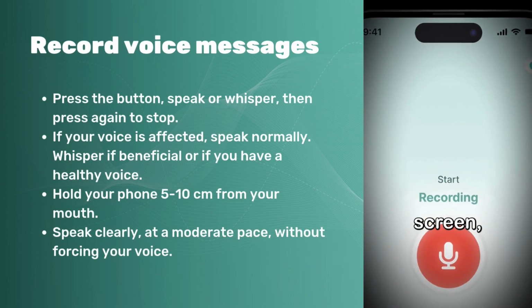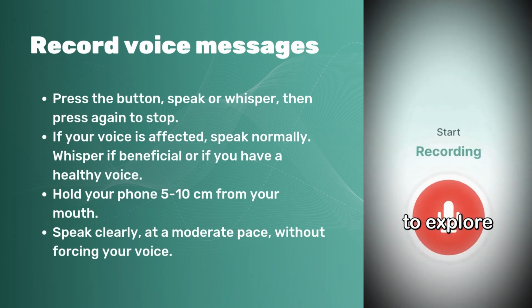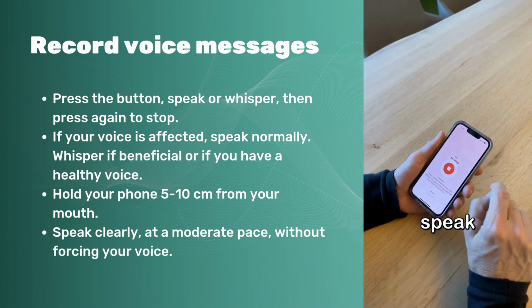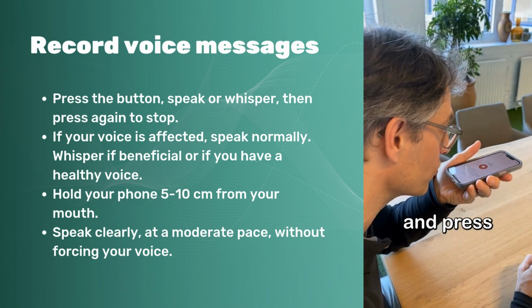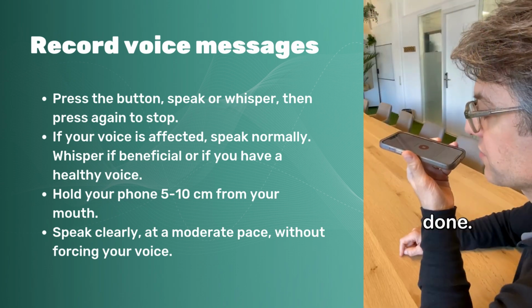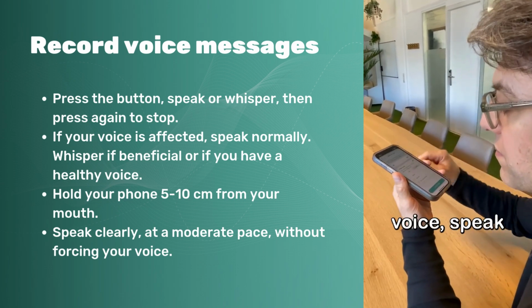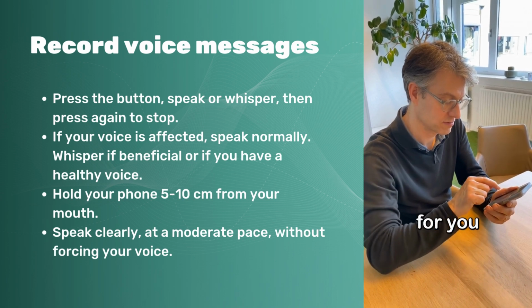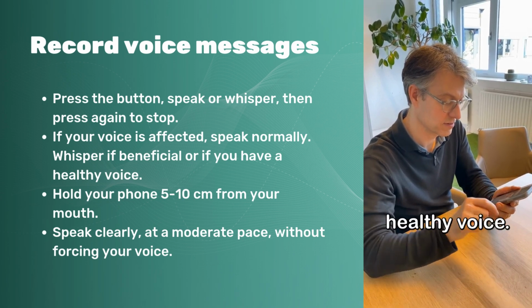In this recording screen, you can record your voice to explore how it sounds with Whisp. Press the button once, speak or whisper a few sentences, and press the button again when you're done. When you have an affected voice, speak like you usually do. Whisper when it's beneficial for you, or when you have a healthy voice.